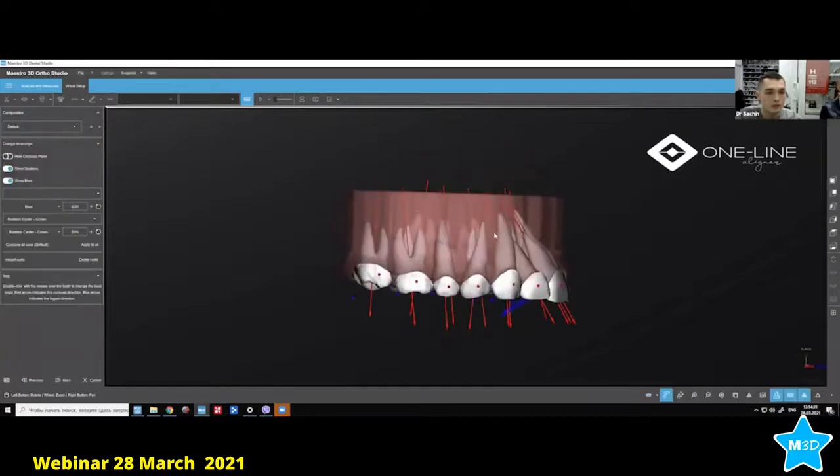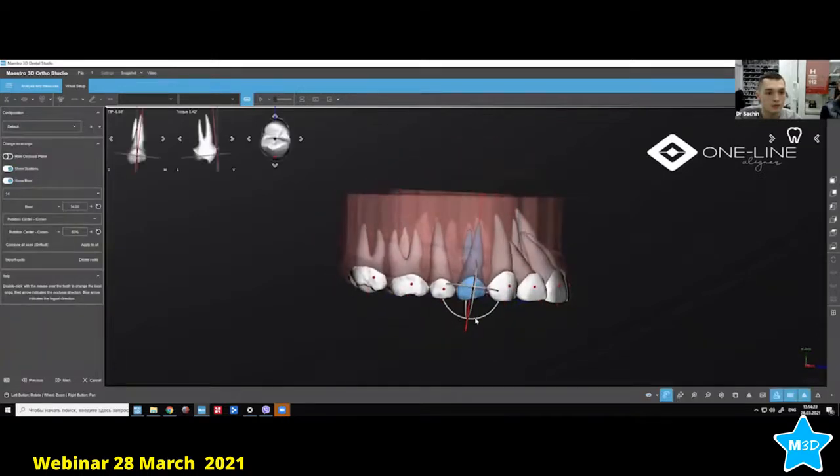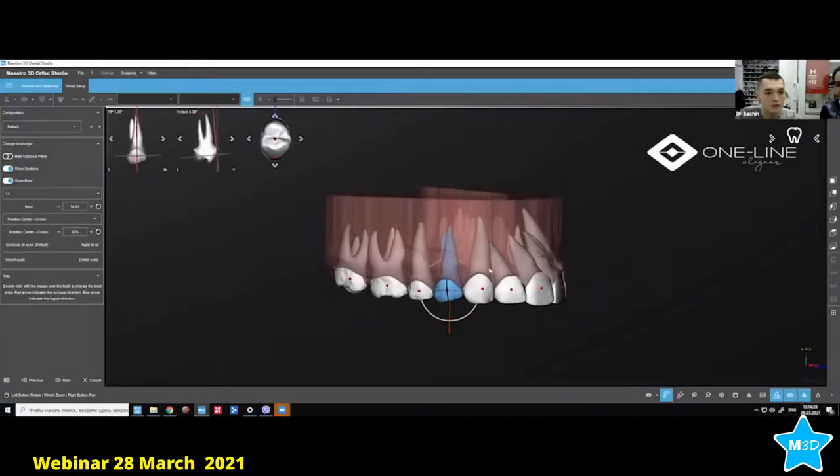Yeah, so everything is fine. The software actually found the outlines completely.